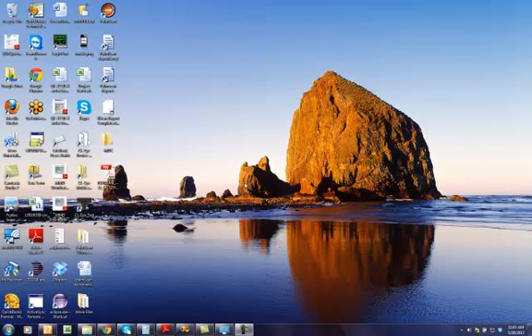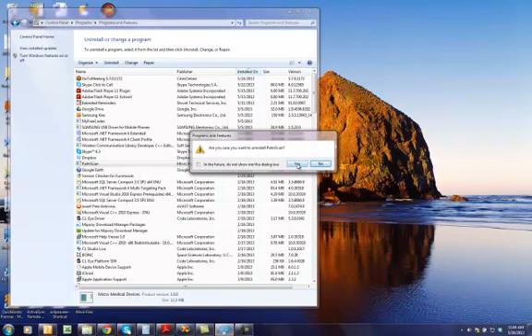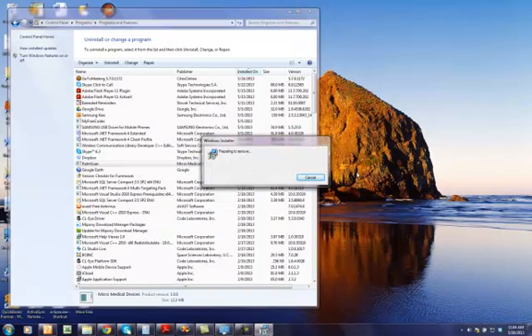I am doing a quick tutorial video for the installation and use of the new mobile PalmScan software. In this video, I will show you how to install the mobile PalmScan and then how to use the new software. The first thing you want to do, if you have an older version of the PalmScan software on your system, is to uninstall the older version. And once you've uninstalled it, you can proceed with installing the new version.